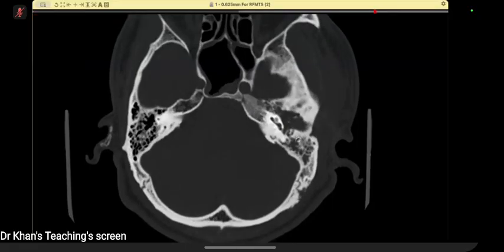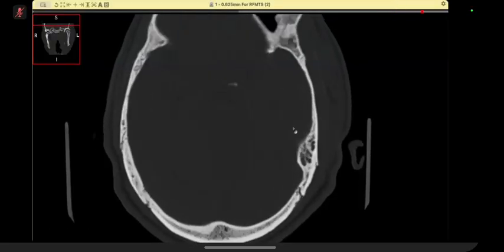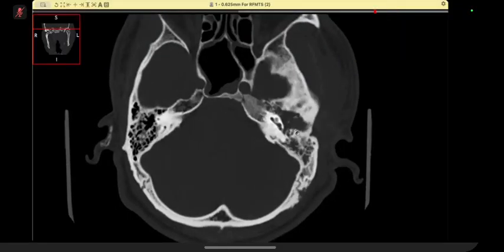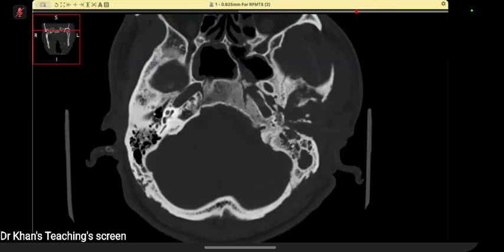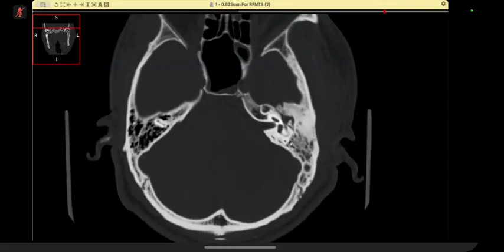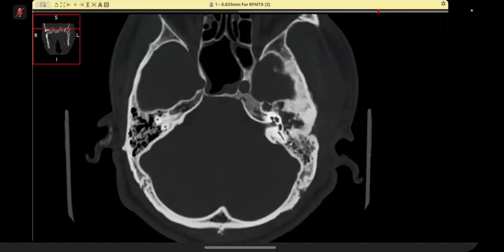Candidate 2, in your hurry you used some other word. You said opacification of the mastoid air cells. What did you say about the mastoid air cells? I wanted to point out that it is filled with fluid rather than air, so it's not aerated anymore. Maybe I should have used a different word. Yes, use the word opaque, opacity. There is a soft tissue opacity in the mastoid air cells, or they are opaque. That is the word you use in the temporal bone or paranasal sinuses.